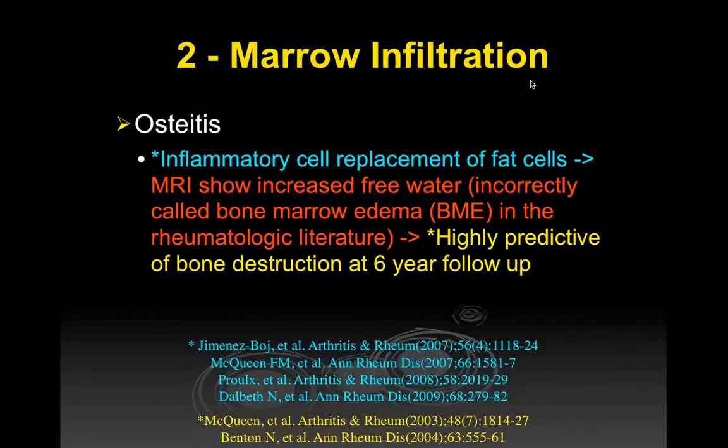And by the way, many people now are recommending using Doppler ultrasound to do this because it gives you basically the same information as the early enhanced MR. And so that might be a good way to evaluate some patients.